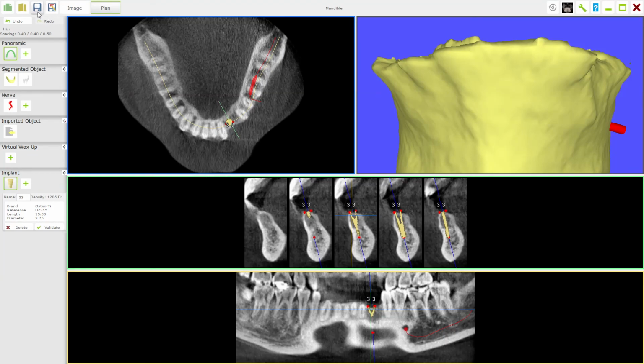Now, you save the image, and then the next thing you will do is send that image to your laboratory or to your template maker, and they will go on and make your guide. And this will be based on this planning that you've done. And that guide is a precise, custom-made measuring device for your patient. And that's why the guides are not cheap to have made. They're printed, they're very accurate precision instruments. They're not made from a bag of cold cure on top of your model, but they're made, and the rings and everything are precisely made to guide the drills along this trajectory, so that we have no doubt about where we're going. So now all that remains to do is for you to send this information to the printers or to your laboratory and start making your template.